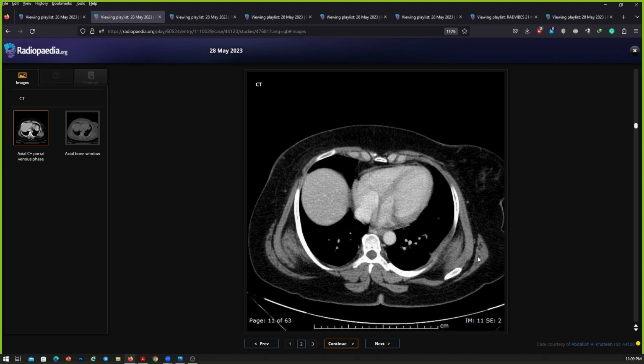So, given the findings, I would like to correlate, since the patient also has an adjacent rib fracture. This could represent any chest wall lesion, such as a resolving hematoma on the left side, and or if there is any history of trauma, maybe. Okay, there is no other history, no recent trauma. The left-sided rib fracture is a very old one.